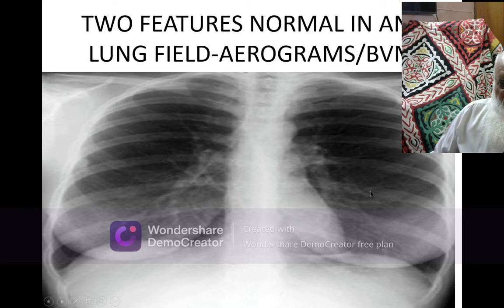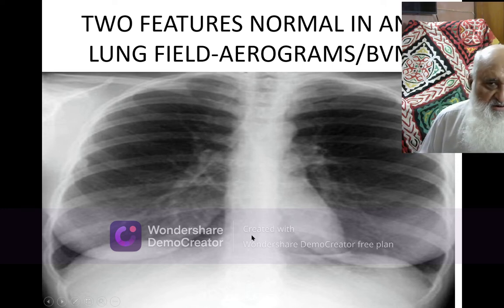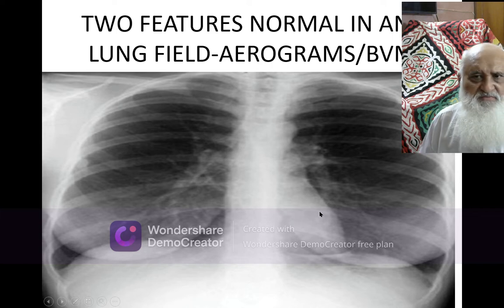If they are crossing this line, it means that at the resting phase the lung field is showing vascular congestive changes. You have seen in reporting that congestive changes are seen. What do you mean by congestive changes? Probably they are bronchitis, and this is not the answer.